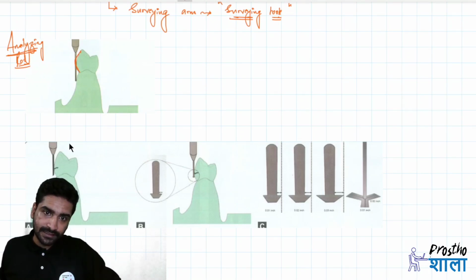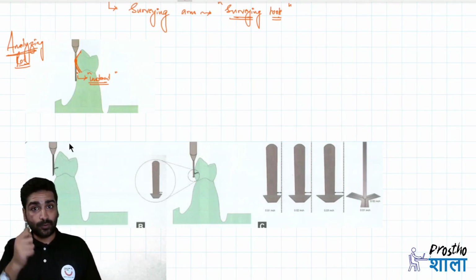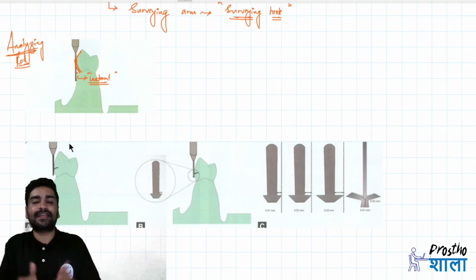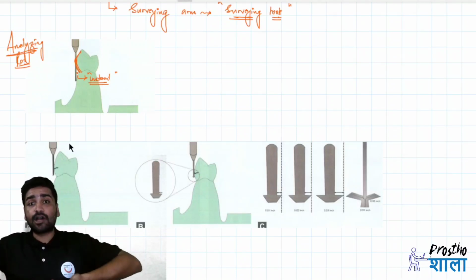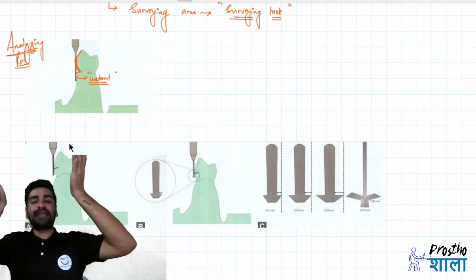When you place this analyzing rod on the most convex surface, you see this white area; that white area is called undercut. Okay. Now in this undercut only your clasp assembly goes and engages. You always think where to place the clasp, how to fabricate a clasp. In your normal acrylic partials also, you always try to place the clasp below the most prominent area. It goes and engages there, so when it has to lift back up, it doesn't come out easily. The clasp has to flex according to the contour of the teeth and then come out, right?